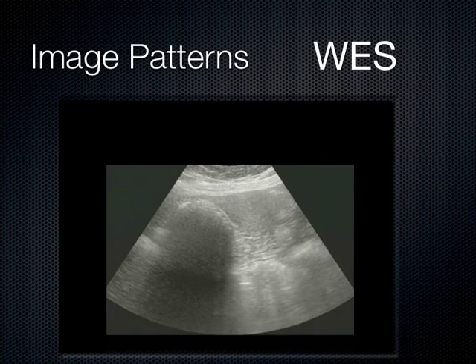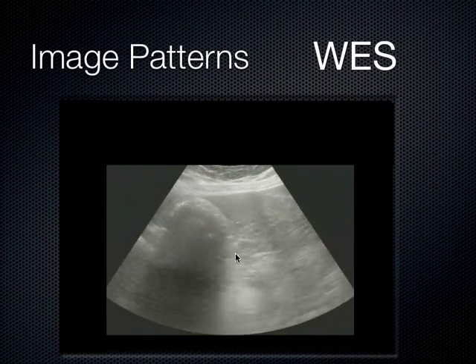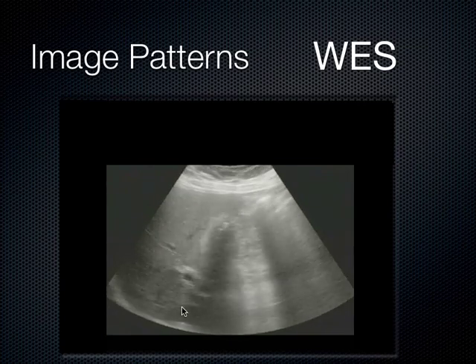Therein lies the conundrum. This is actually a true WES sign here. We see a contracted gallbladder around a whole bunch of stones, actually. And those collective stones together cause this big fat shadow to be coming out of the liver.